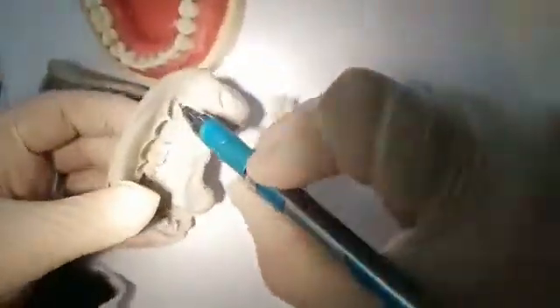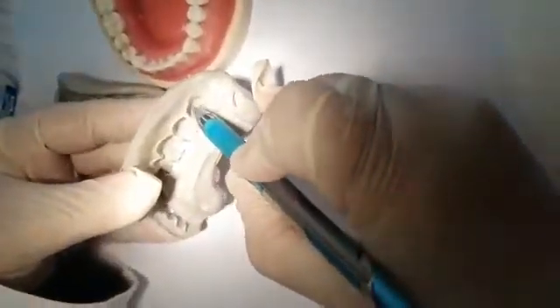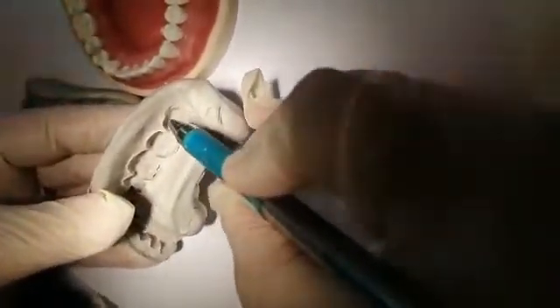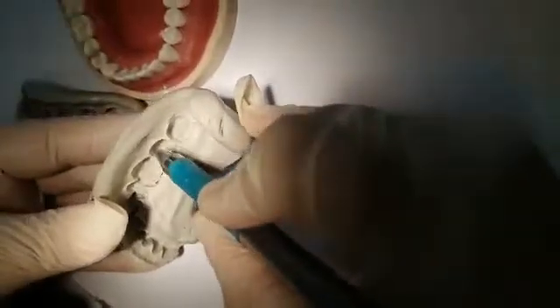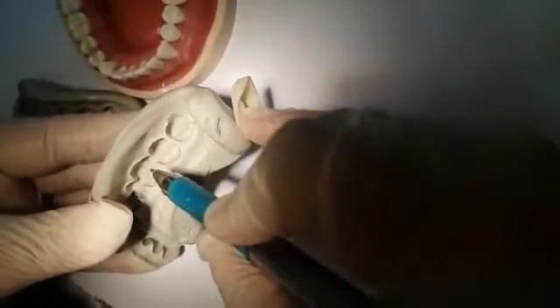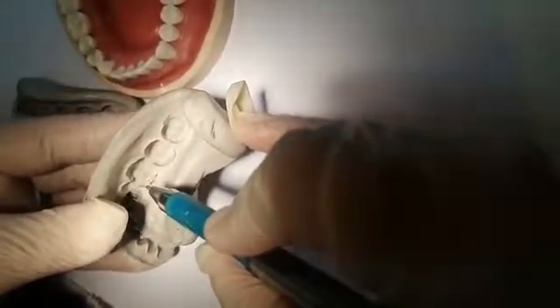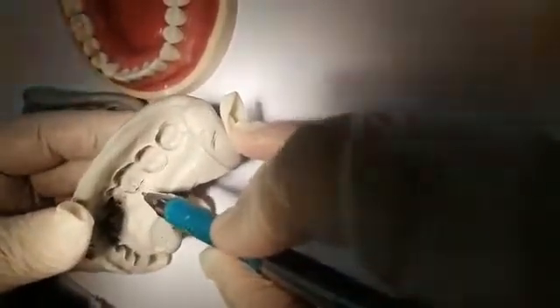I'm talking up here about drags first. Why do drags happen? First of all, what I mean by a drag is that the material has been dragged away from the tooth and did not capture the marginal gingiva around the tooth. If it doesn't capture the marginal gingiva, that means I don't have an accurate impression of the finish line, if it was a finish line procedure. Or even in polyvinyl siloxane, it's present.